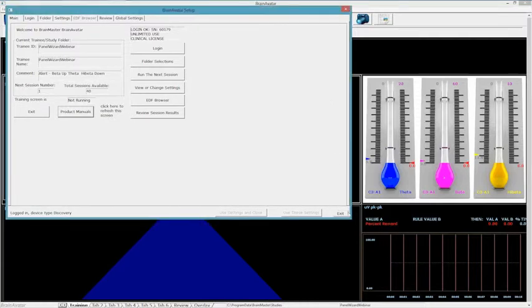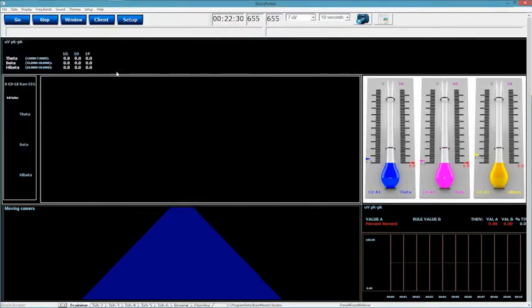And as you can see, it has been custom built and custom designed for a resolution of 1920 by 1080. It fits perfect for my screen, of course, because I designed it on my screen. So it's going to look really gorgeous on here because that's what it was designed for. Now, for your screen, on the other hand, it might not fit as well.